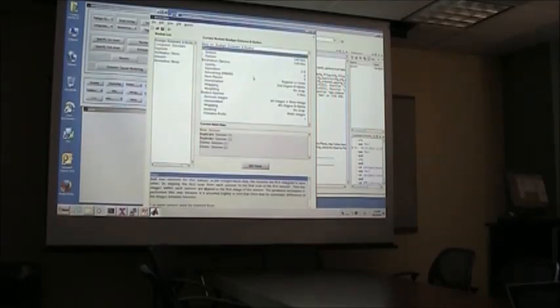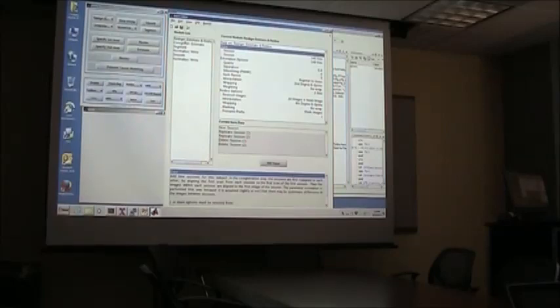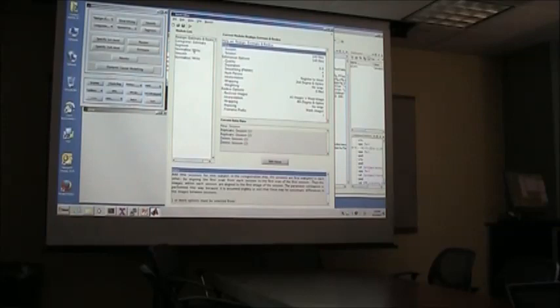This is from one of our own data sets. Instead of doing all these steps one by one, you can set up a job file to do all these steps in one go. Last week we first did the realignment, then co-registration, then normalization, etc. You can put these steps one after another and save it like this. Does it make sense? This is also another way to speed up the whole process.